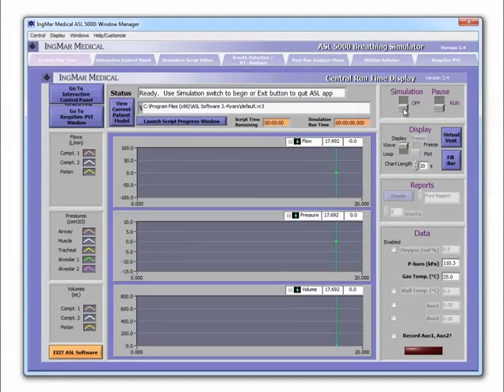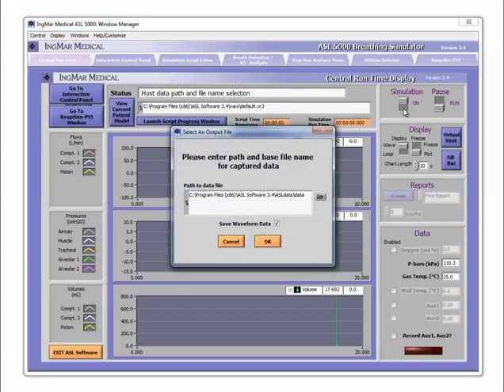If I turn that on, it then asks me where to place the data. So we're doing two things here. We're activating the lung model that we currently have ready to go, and I'll go into that in a moment. And then secondly, it's asking us, where do you want to place that data that you collect?